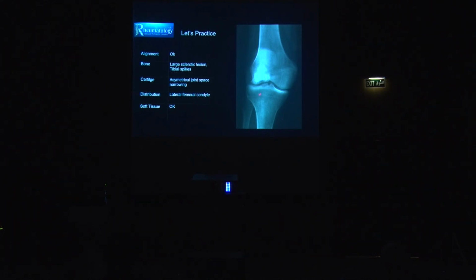And if you don't know what this is, you can tell your radiologist, I have an X-ray of the knee that has an abnormal texture, I want to discuss it with you, what could this be? As long as you know that there is a problem in the texture, you don't really need to be an expert in finding the diagnosis, because there is someone more specialized to tell you, which is the radiologist.